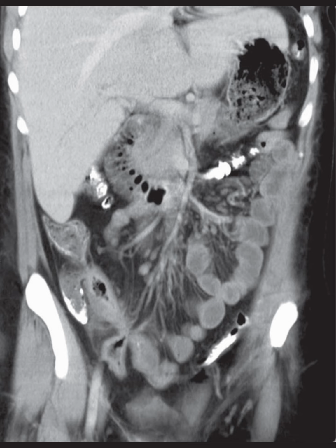Similarly, gas bubbles in the bladder on CT, along with abnormal sigmoid colon next to the bladder, suggest a colovesical fistula. Getting a precise delineation of fistula tracts and identifying the underlying cause, whether benign or malignant, can be challenging. Cross-sectional imaging, barium studies, and endoscopy are crucial here, and sometimes a biopsy might be needed to clarify things.